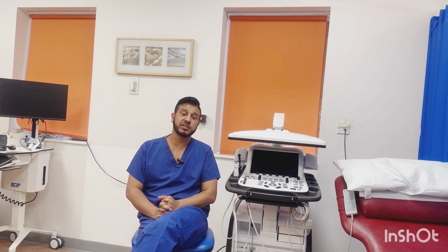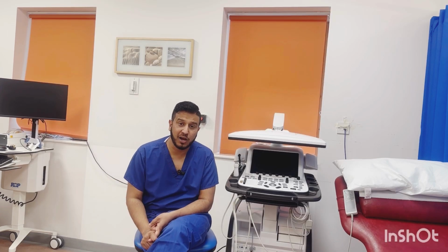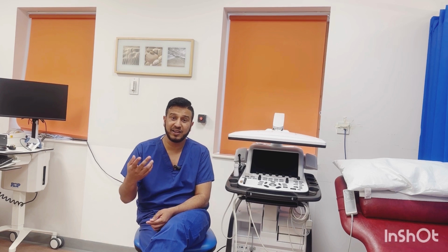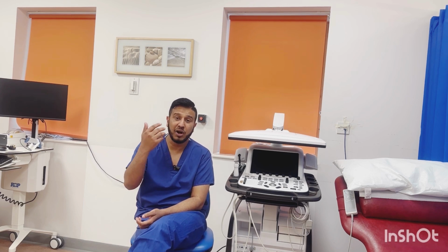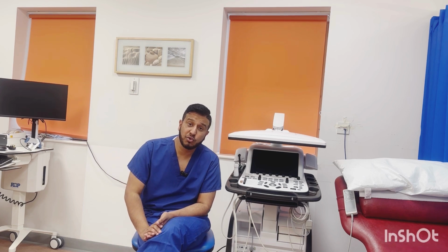In these patients, the first thing you need to assess is your measurements. Try to exclude measurement errors. Mainly look at how you get the Doppler, whether you use the PEDOF probe to get the higher gradients, and also look at your LVOT diameter. Especially as these patients are very elderly and have calcified valves, measuring the LVOT could be very challenging.